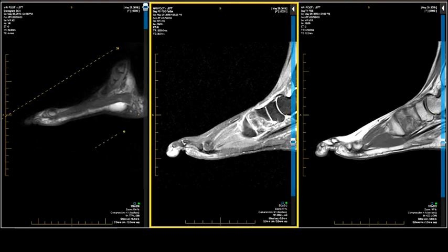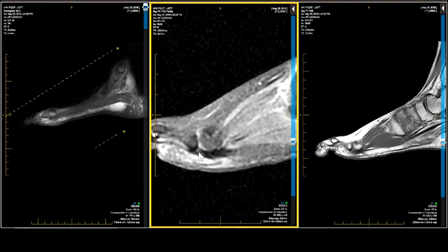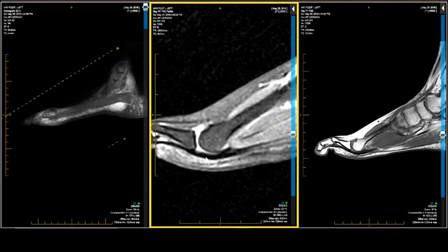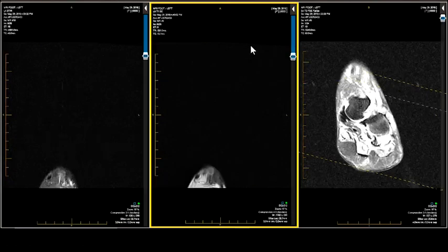And as I'm scrolling the toes, you can actually see the plantar plate right there. That's the plate. Resolution isn't very high. Let's go to our long axis view. Maybe take a short axis view.